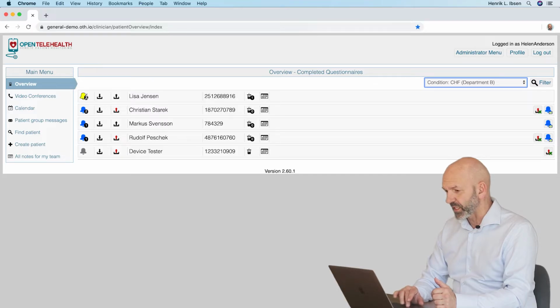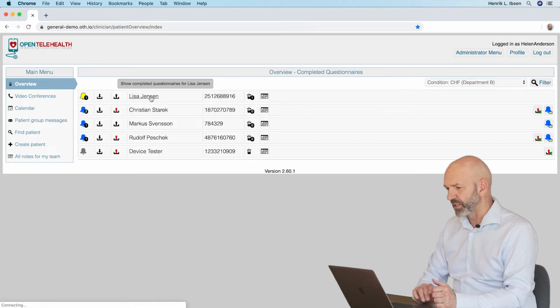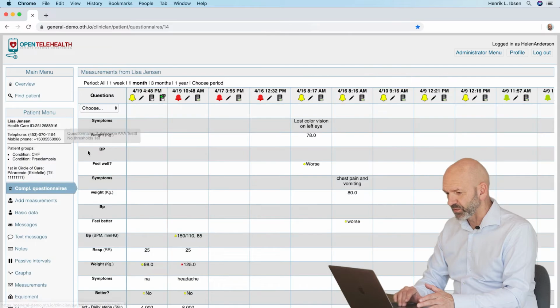And since I'm a nurse with specialty in heart failure, I have my patients, and the other ones with diabetes or COPD or pregnancies or midwives, they have their patients in their patient groups and operate with them and receive their data. And today I have on my list Lisa. And before I look at the data that has been submitted from Lisa from home, I will have a look at what kind of patient she is.